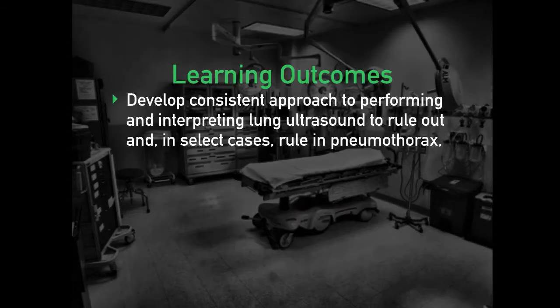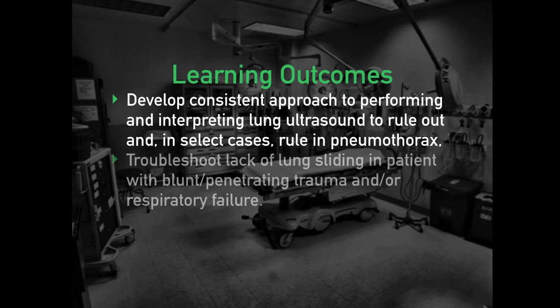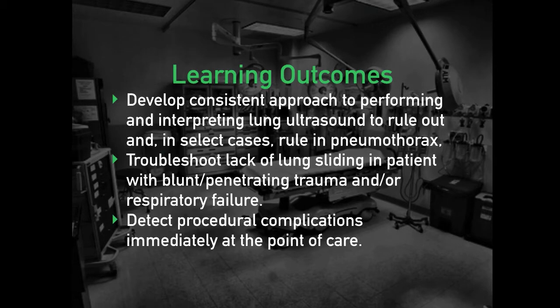We have some specific learning outcomes for this tutorial. Focus on developing a consistent approach to performing and interpreting lung ultrasound, to examine for pneumothorax, troubleshooting the absence of lung sliding, and detecting procedural complications immediately at the point of care.